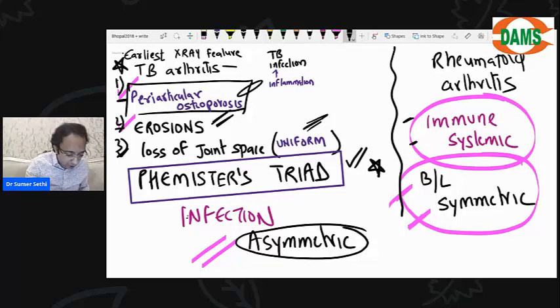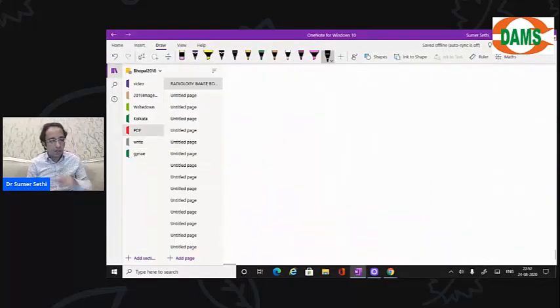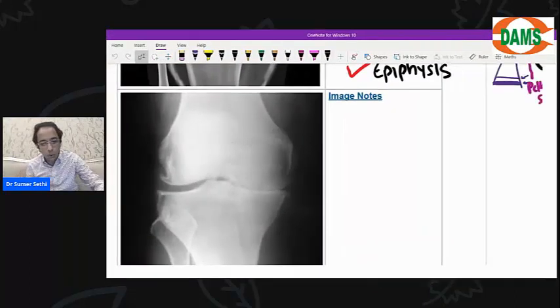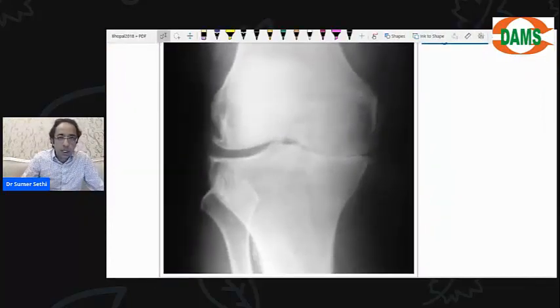Okay. Now let's see and understand. Everybody understands? Let's go back and we see the image and then we'll come back with another concept. Some of you are unable to understand, so I'll show you the image. Now, see this X-ray that you will see multiple times in your clinical practice. ये तो देखोगे बेटा, ऐसा हो ही नहीं सकता ना देखो.